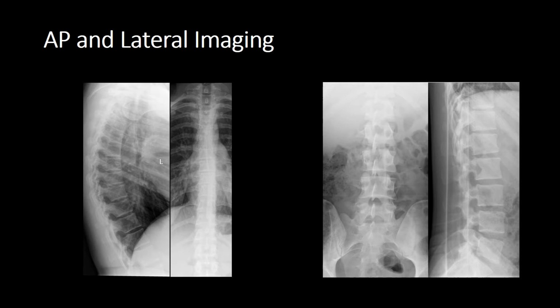So like your cervical spine, we want to be interested in our lines. Make sure that your anterior longitudinal line is in alignment. Look at your posterior longitudinal line, that should be in alignment too. This is a beautiful picture. Quite clearly see the intervertebral foramina. You want to go around the cortex of every single vertebral body so you don't miss an subtle fracture. Look at intervertebral disc spaces, are they all of a similar size? There's no diastasis or marked compression.